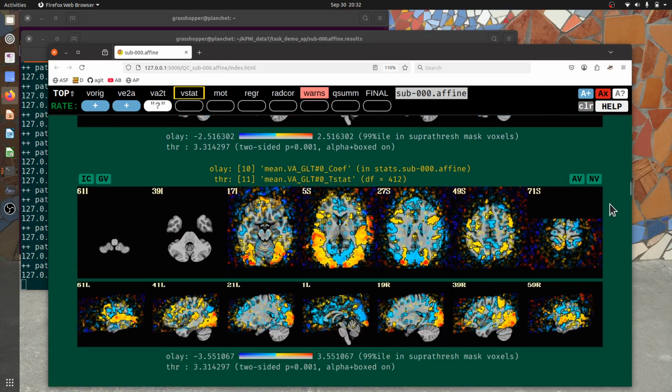And then finally, we had also included just the mean audio-visual response. Again, everything that we've built up to here holds. Transparent thresholding, you can see the scale of this. This is still units of BOLD percent signal change for an average response. Not even average magnitude, but just the average of the beta weights for vis and aud. I don't know that we particularly use this, but it was just another example of a contrast, a general linear test that we could set up.